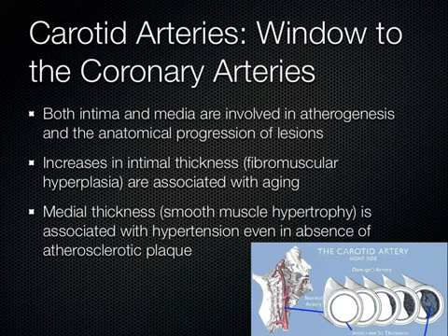Surrogate markers usually aren't perfect. They're not like pathology looking straight at the disease itself, but they are convenient, non-invasive ways of checking for stuff going on in our patients. Same thing with this carotid artery intimal medial thickness, or CIMT.